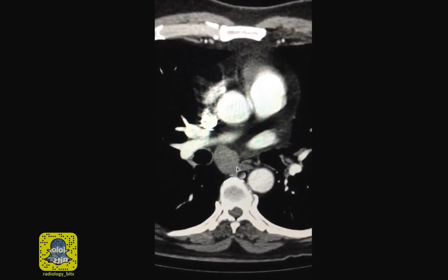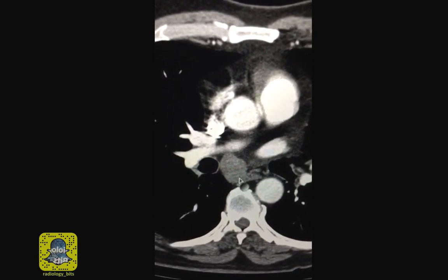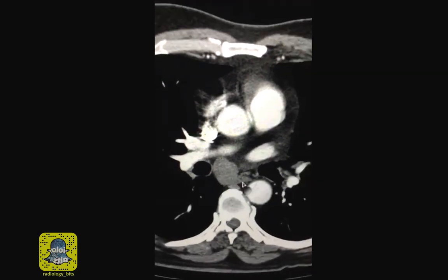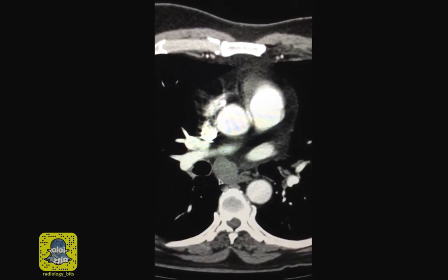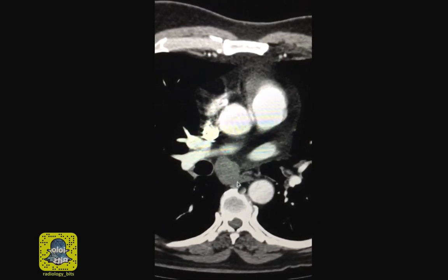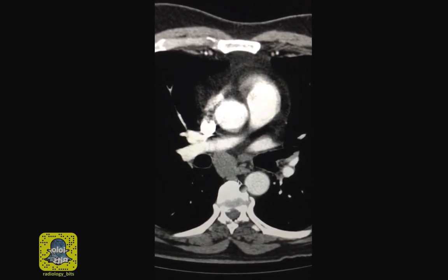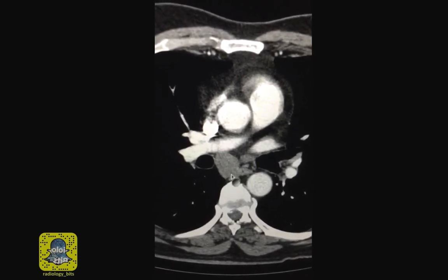A very important question is, could this be a fluid-appearing necrotic soft tissue mass? A necrotic soft tissue abnormality could mean a necrotic lymph node from metastasis, lymphoma, or infection. And that's fortunately not the case here, since a necrotic lymph node would show you a thicker rim of enhancement or nodular peripheral appearance. By knowing these small bits and pieces of information, you change this patient's course from being unlucky to a lucky guy who has a benign bronchogenic cyst.